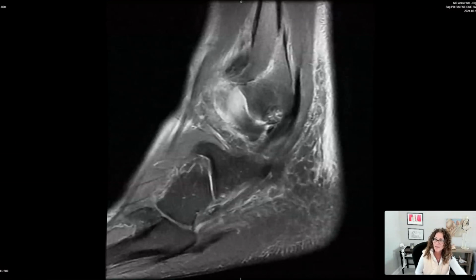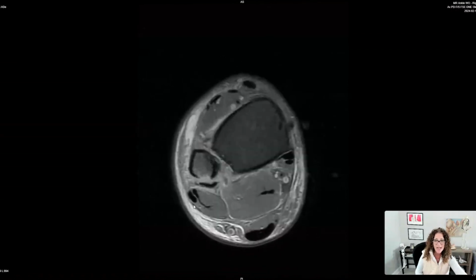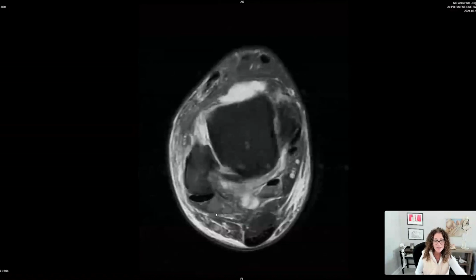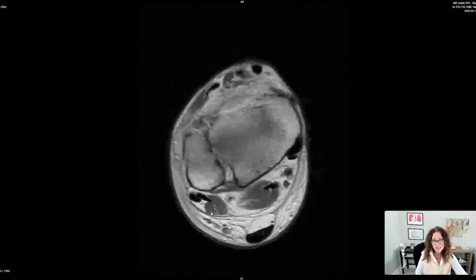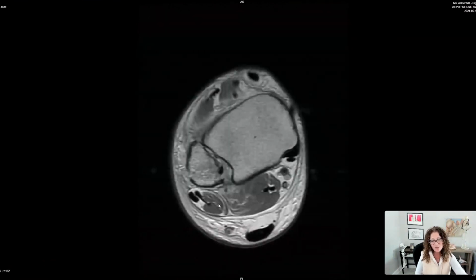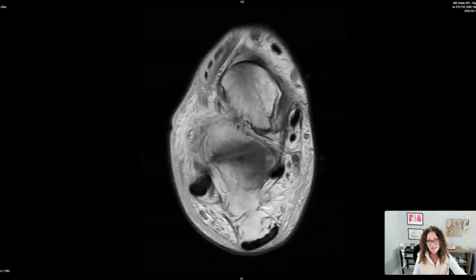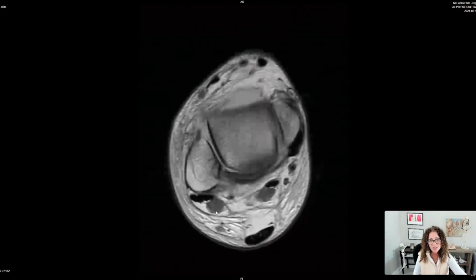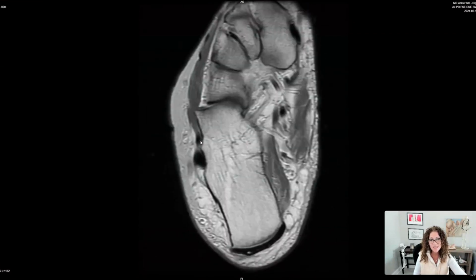So moving back to my peroneal tendons, I want to assess the superior peroneal retinaculum. And also, is there an accessory muscle here? We do not usually have muscle belly at the level of the lateral malleolus. So this is two choices, either an accessory peroneus quartus or an accessory peroneus brevis, or both. And so what I see is that there may be a small tendon that's attaching to actually the lateral side of the calcaneus. I would say that there's a quartus here, and there's also a low-lying brevis. So there's actually both features here of what I'm seeing for that.